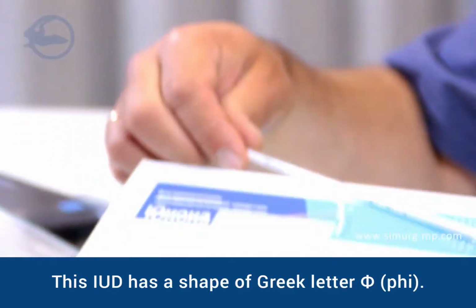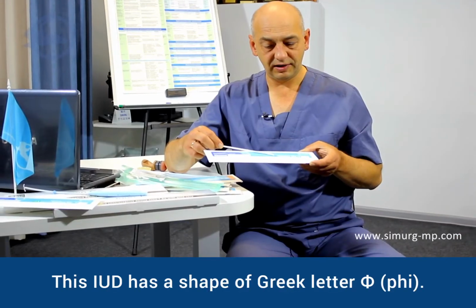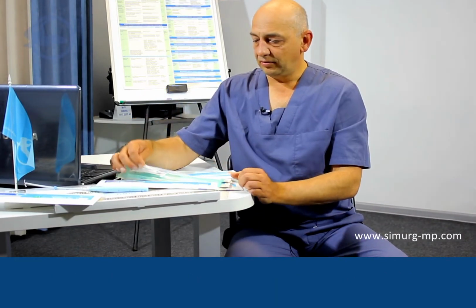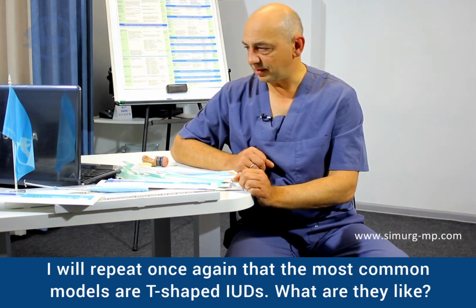This IUD has a shape of a Greek letter phi. I will repeat once again that the most common models are T-shaped IUDs.